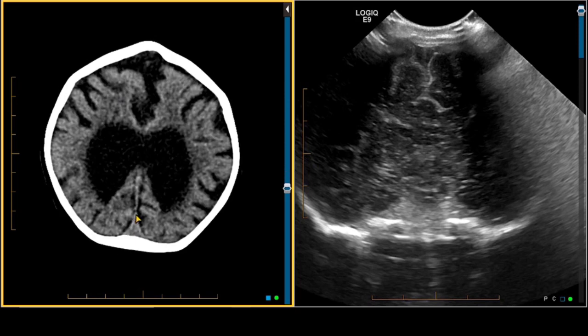Now, posteriorly, we are seeing a falx cerebri. Anteriorly, we do not see a falx cerebri. So this is an individual that has elements of a holoprosencephaly spectrum disorder, but posteriorly, we look like we have two different cerebral hemispheres, unlike the case of the alobar holoprosencephaly that we saw. But anteriorly, we're seeing signs of a single cerebral hemisphere.